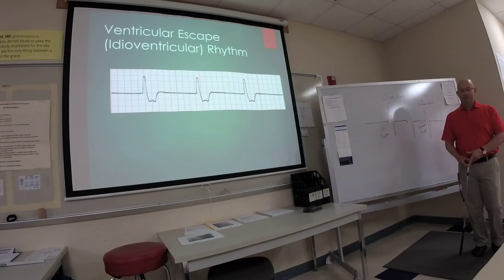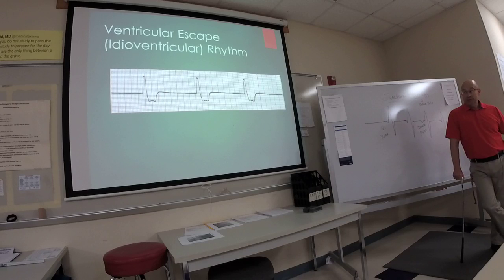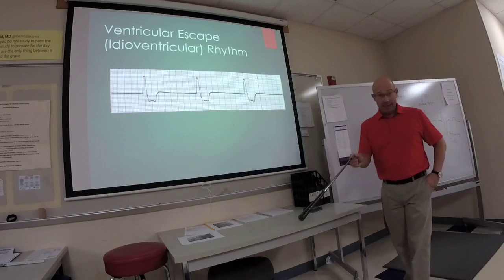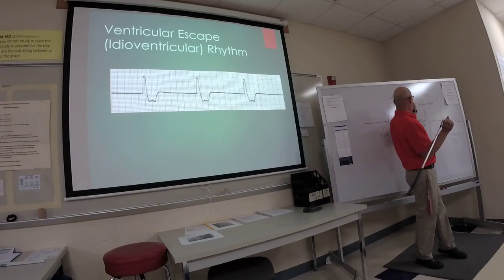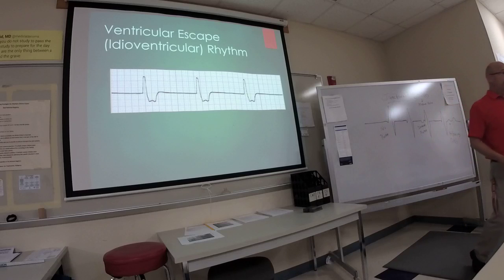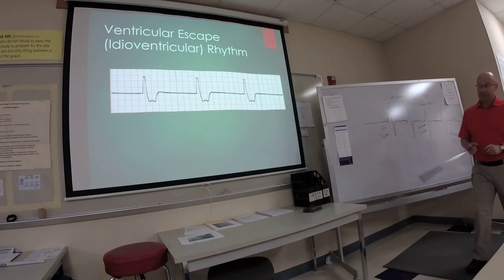Well, it's not a P wave at all. Yeah, the rate. The rate is too slow. It's at 30. It's not the junctional 40 to 60.